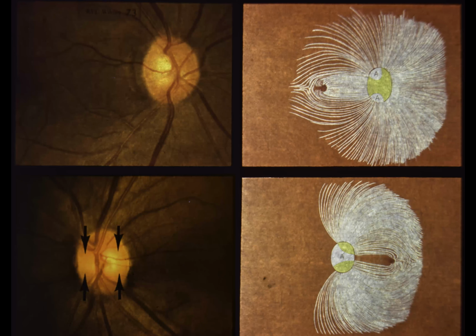Slide 73. Hemianopic atrophy from optic tract lesion. This 35-year-old male developed a slowly progressive left hemiparesis and a left homonymous hemianopia. Visual acuity was 20/20 OU. Upper left. The right optic disc shows mild temporal pallor with some subtle loss of nerve fibers in the superior and inferior arcuate regions. Upper right.